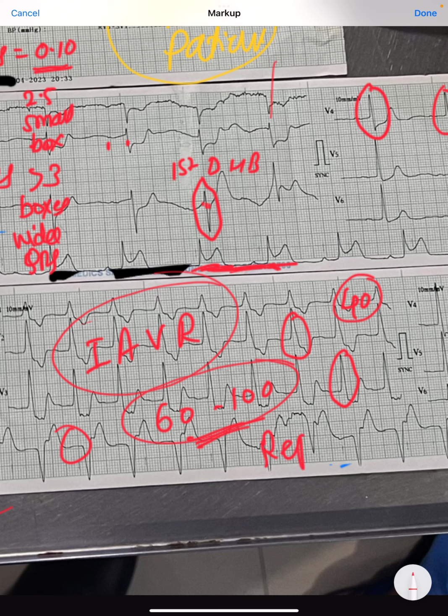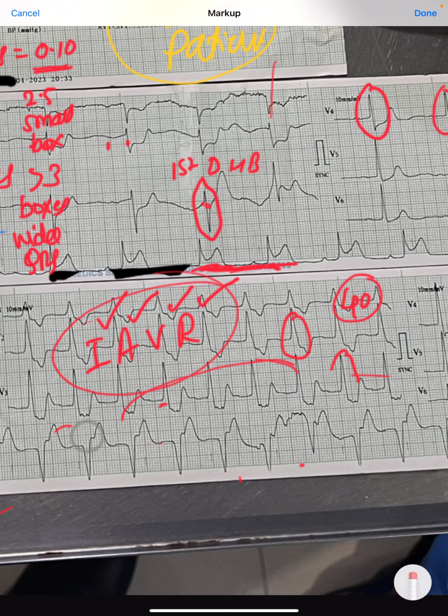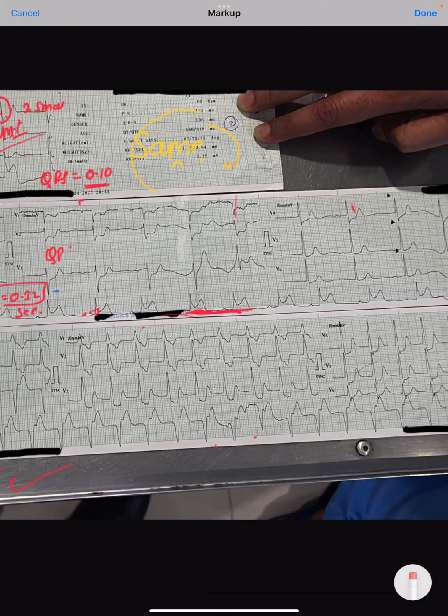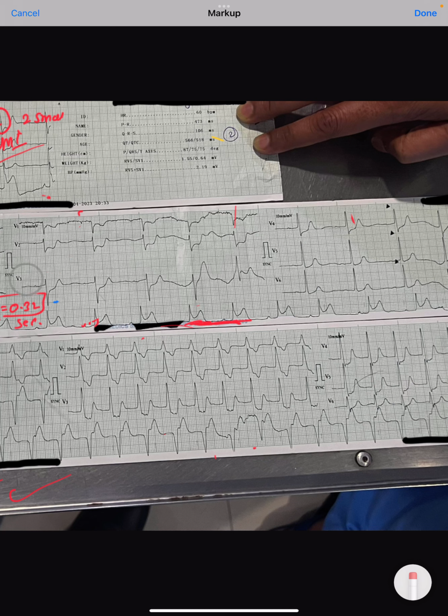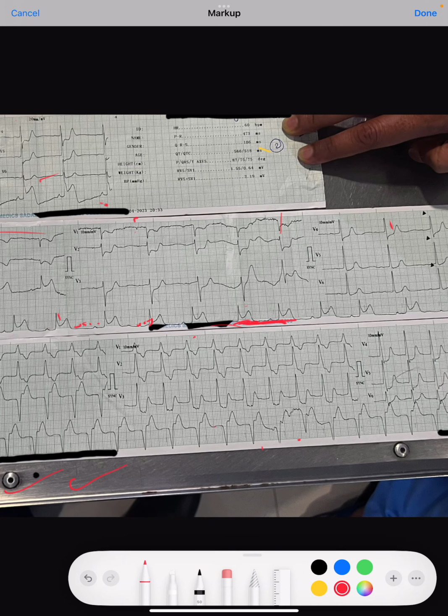It is called a reperfusion rhythm or reperfusion ECG strip, and this is typically idioventricular rhythm. You don't have to do anything to this. This is one of the indications of successful thrombolysis, and patients are most of the time totally asymptomatic. You simply have to wait and watch till the patient gets better. If the patient gets unstable, like if the patient lands up in VT or VFib, then it may need treatment. But for this particular rhythm, if the patient is stable or asymptomatic, you don't have to do anything.